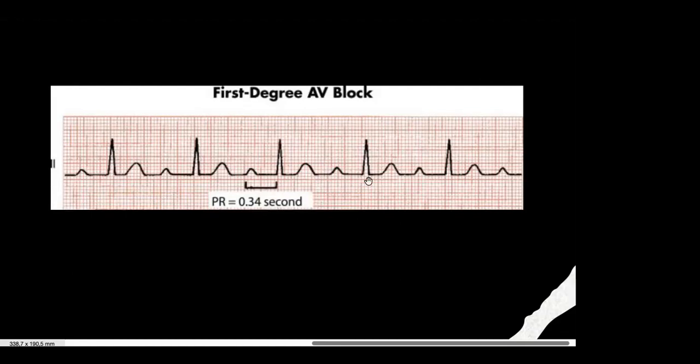So what do you do if you find an ECG like this? Normally, if you're working in an emergency room, or in the Department of Cardiology or internal medicine, you don't give therapy to the results without clinical symptoms. So in most cases, people with first degree AV block don't realize anything, and you don't intervene because there are no symptoms.